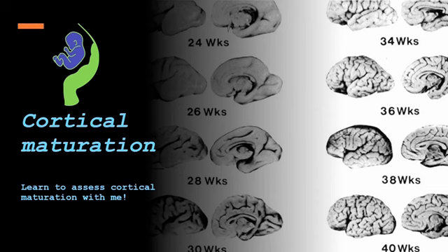In this video, we will explore how to assess cortical maturation in the fetal brain. By the end of this session, I'm confident you will have a clear understanding of how to evaluate various sulci that appear during fetal brain development.